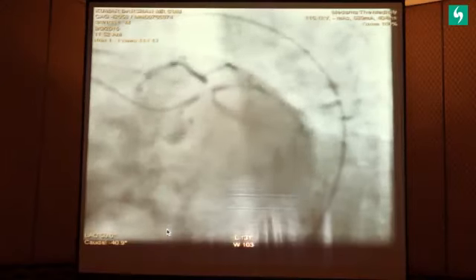So the discussion here is, the first question is whether it should go for surgery or whether it should go for angioplasty. So if we look at the criteria that defines these two procedures, here is actually a trifurcation stenosis, because there are three big branches coming out from this. There is ostium of LAD which is involved. There is ulceration at the distal end of the left main.